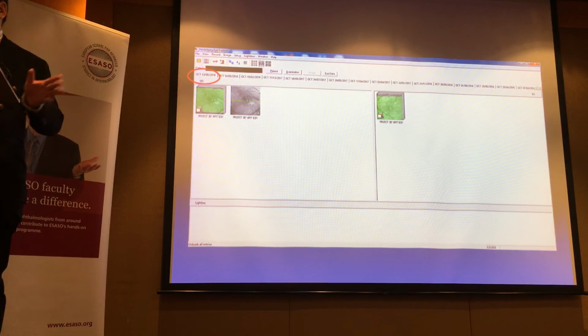Now, I'm not suggesting you use OCT en-face images to look for hemorrhages. That's not my point. But my point is, you have this info, use it. Okay. As I said, if it's here or up there, the scan will not show it. Actually, technically, it did involve the very last line. But how many of us look at the last line?